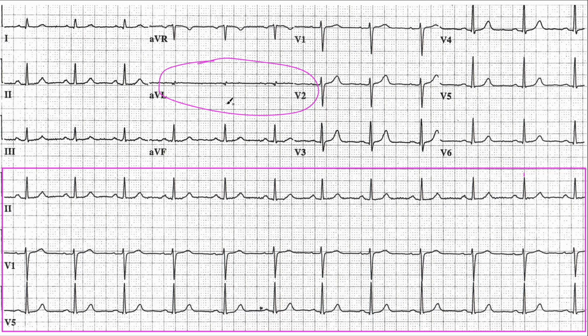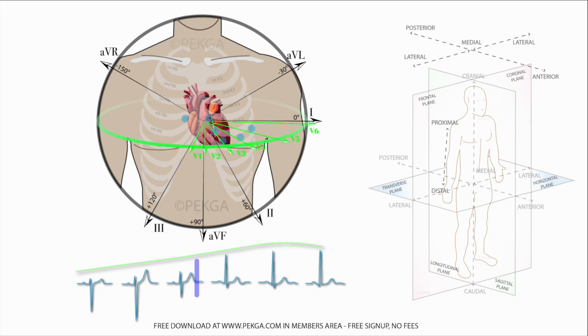First thing I would do is double check the electrode. Now, which electrode do you double check? For those of you who are new to this ECG game, if you will, AVL corresponds to your left shoulder. Now, there is no electrode for AVR, AVL, or AVF. Those are augmented leads. They are calculated using the leads of Einthoven's triangle, leads 1, 2, and 3. So they are a mathematical derivation from whatever's going on with the overall signal that's coming from the heart. So there is no electrode.